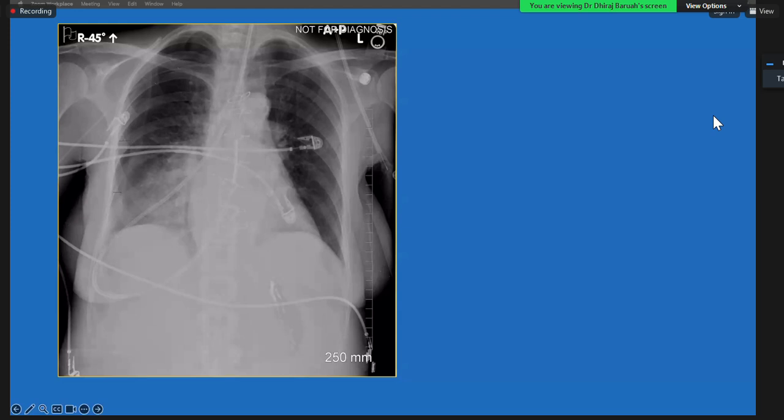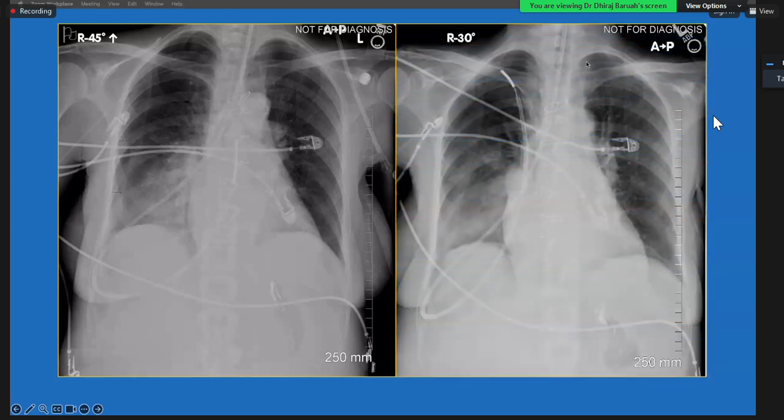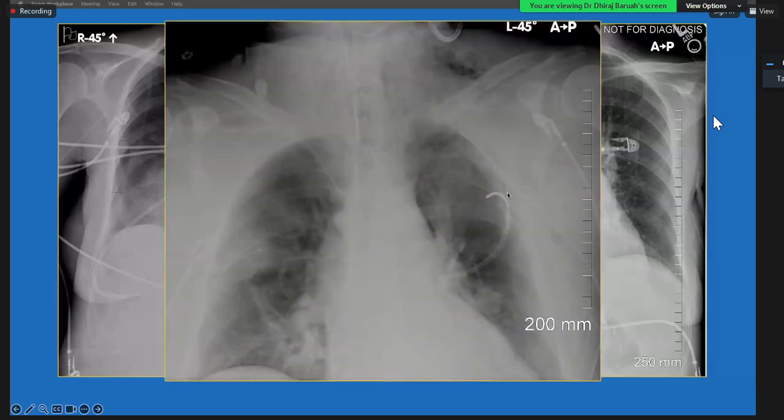You need some expertise to put it in the trachea, and as the right main bronchus is vertical, you will see it is often going to the right side. This is another example where it went to the bronchus. Sometimes the gastric tube goes to the bronchi, and sometimes I have even seen cases where it goes to the left-sided bronchus. So that's crazy.